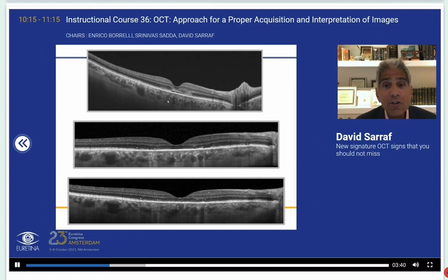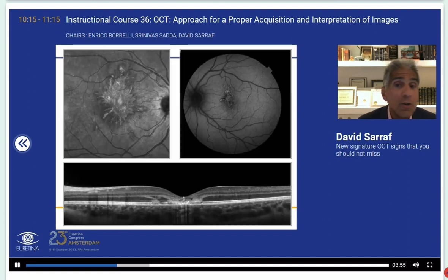As I mentioned, initially these acute placoid lesions start with ASH lesions where you can see the radial configuration of the Henle fiber layer. They resolve and leave RPE changes as a legacy of these placoid lesions, but acutely you'll see ASH. Another anterograde disorder that causes ASH is laser-induced maculopathy.